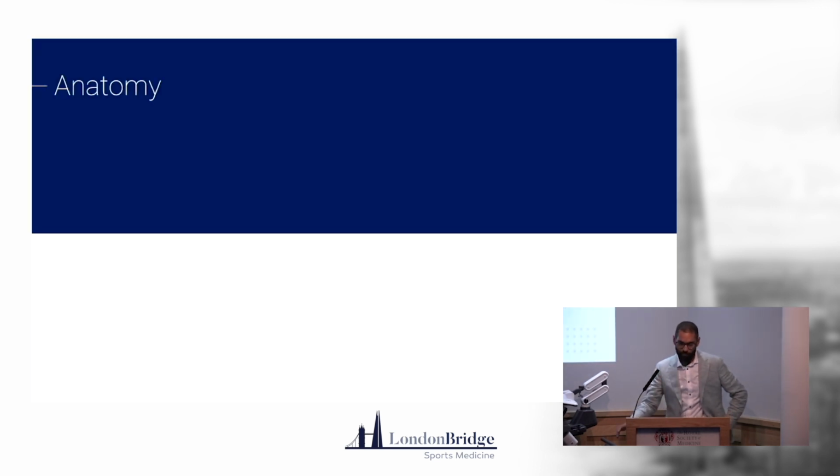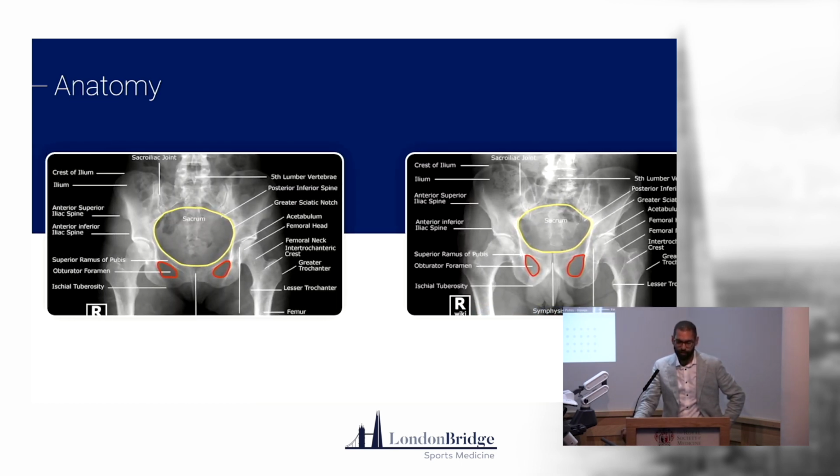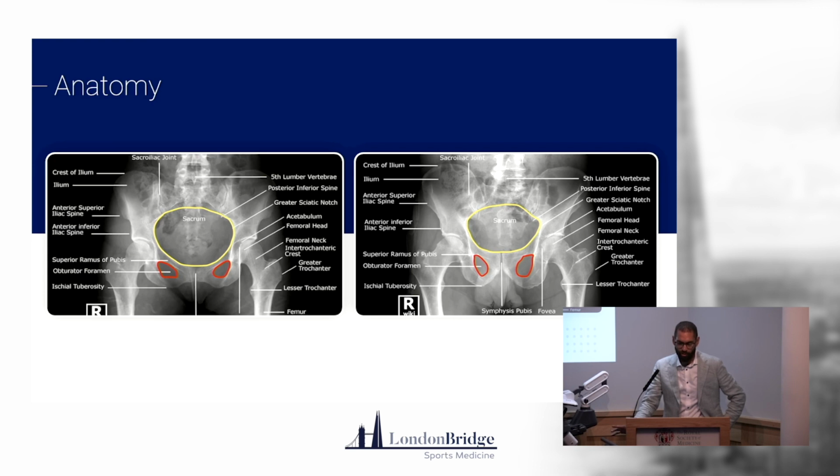So, alignment. Oh, before alignment, sorry, anatomy. With an X-ray, you can really be detailed about all the anatomical sites and variations of the pelvic area and the hip joint itself.